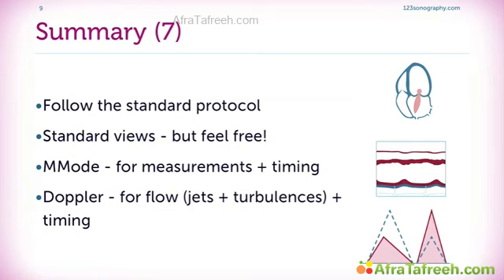M-mode still has its importance, but basically only in 2 applications. First, measuring the size of the aorta and the left atrium, and second, measuring the left ventricle, the septum, and left ventricular function. Doppler should also be performed in every routine, especially across the mitral valve, especially across the aortic valve, but you can also use it for the tricuspid valve, and you can even perform tissue Doppler. Doppler allows you to measure velocities across the valve or even within the heart, and also timing of events, and color Doppler helps you to note where turbulences are, which then again might help you in assessing the velocity or the pathology there.